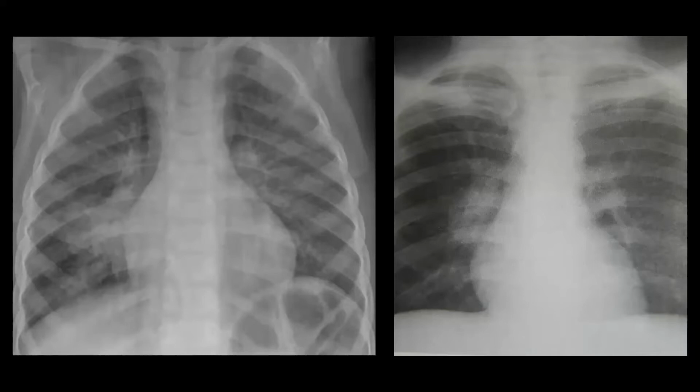All right, so this slide I put in here because I think these are 2 good examples of what I would consider more subtle chest X-ray findings. This group of people on the call probably see these right away because you're used to looking for things like this. Full disclosure, these are not pregnant women. I actually don't have very many images of pregnant women, neither does Google, I'll just say. But I do think that these are 2 really good examples.